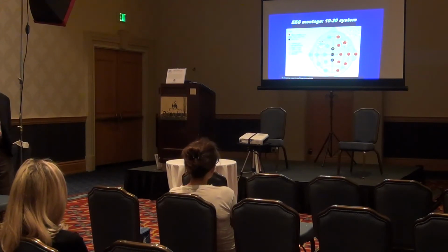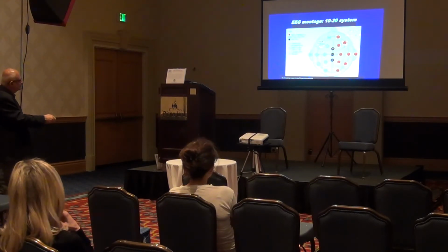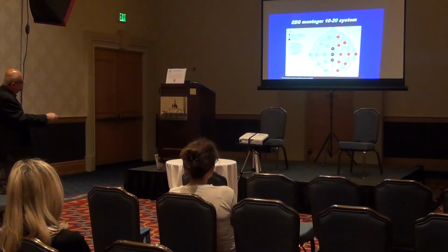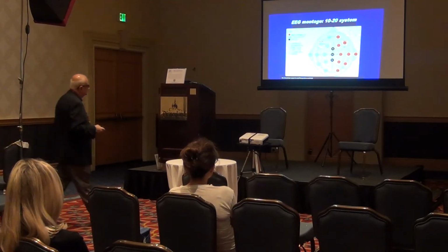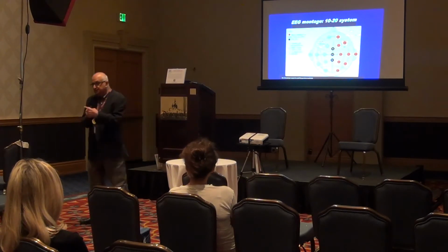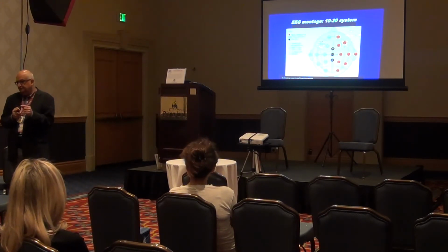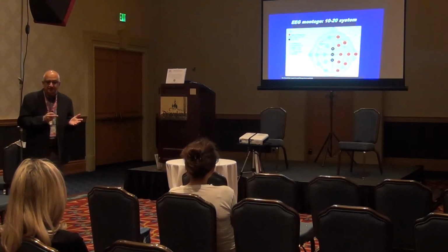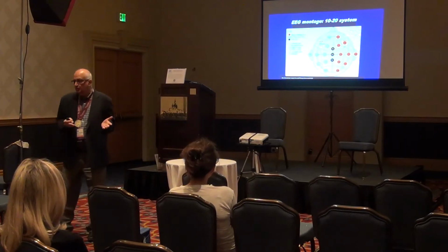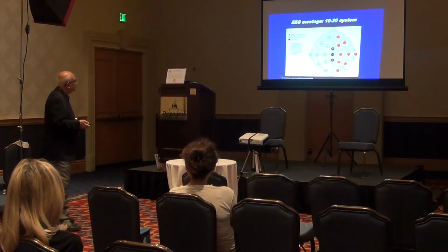So you may hear sometimes a resident asking, are we looking at a double banana? What they mean is, are the two sides connected this way and this way, right? Those are just names for some montages, but the idea is always, if there is focal activity, we want to try to localize it. Of course, none of this applies in a generalized epilepsy, where activity may be in all electrodes, similar, okay?